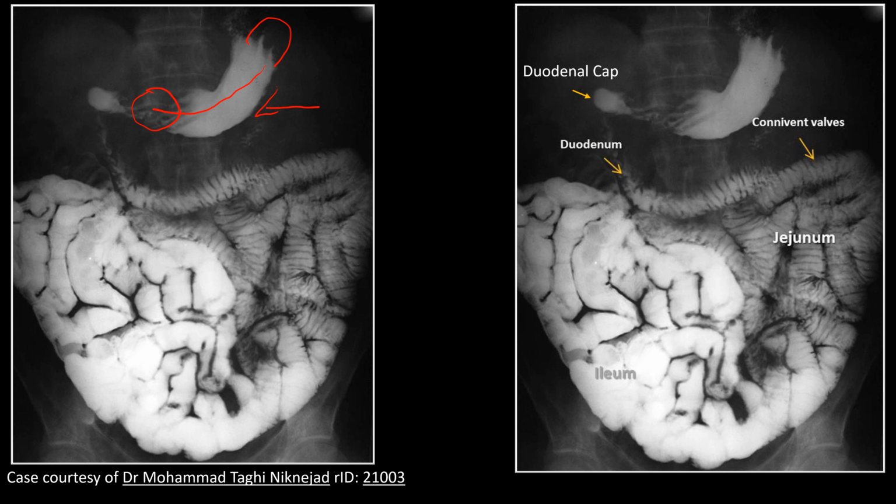The beginning of the first part of the duodenum shows a well-formed duodenal cap produced by poorly developed circular folds of mucous membrane and the protruding pylorus into it. The rest of the duodenum has a characteristic feathery or floccular appearance due to the presence of well-developed circular folds.